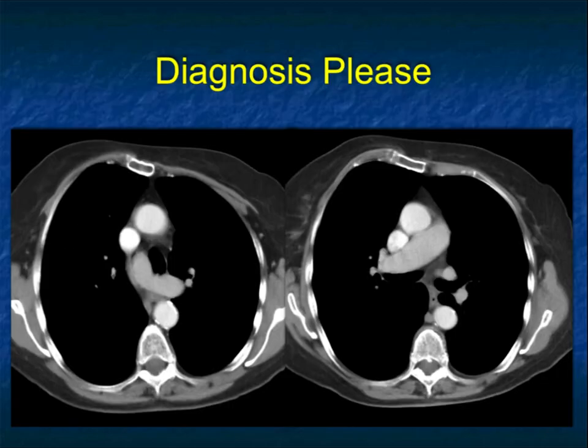You can see this one here located very nicely in the subcarinal region and extending to the right. Now, other things we can see in the mediastinum which simulate masses are vascular abnormalities. In this case, you look at the main pulmonary artery and right main pulmonary artery, it looks great. But that left pulmonary artery, what's going on here? The left pulmonary artery, which is always anterior to the trachea, is posterior to the trachea and between the trachea and esophagus. And it's tracking not from midline to left, but from right to left.